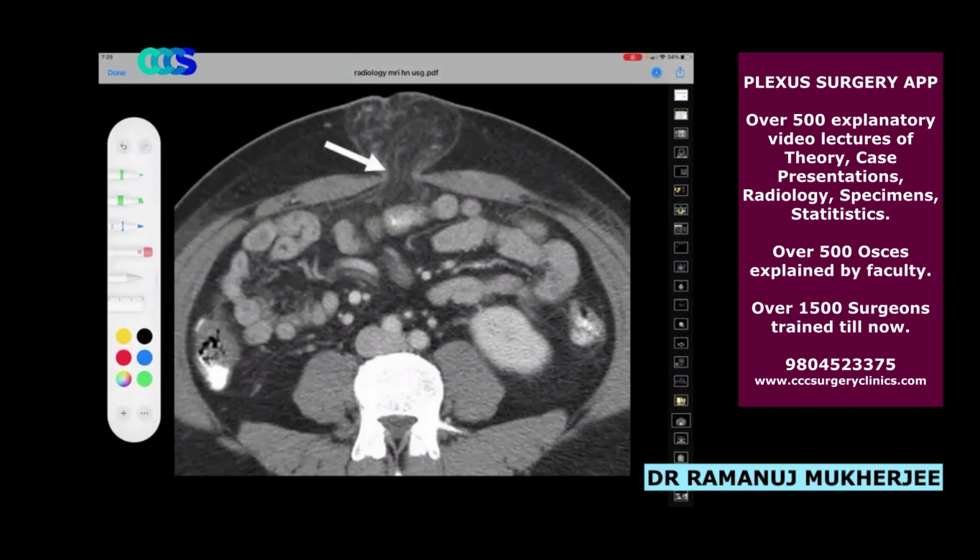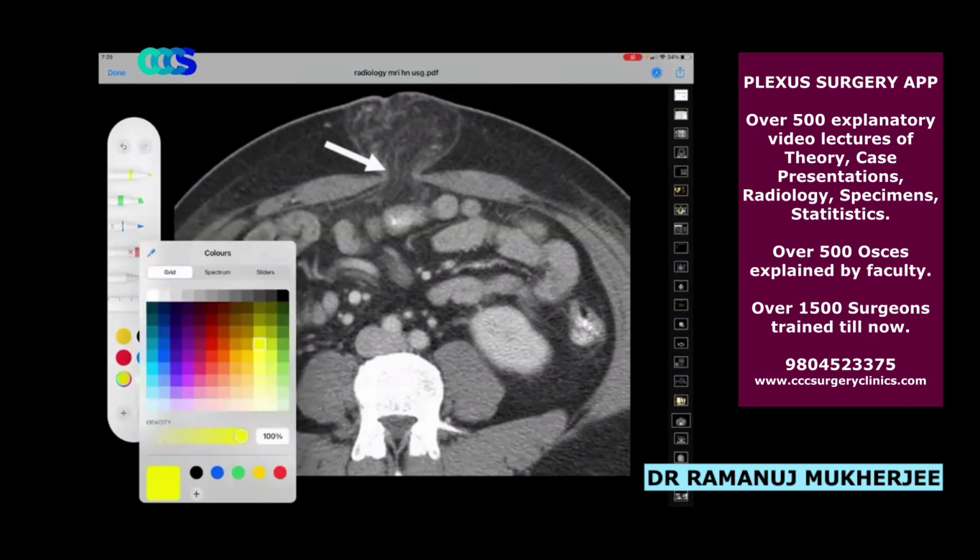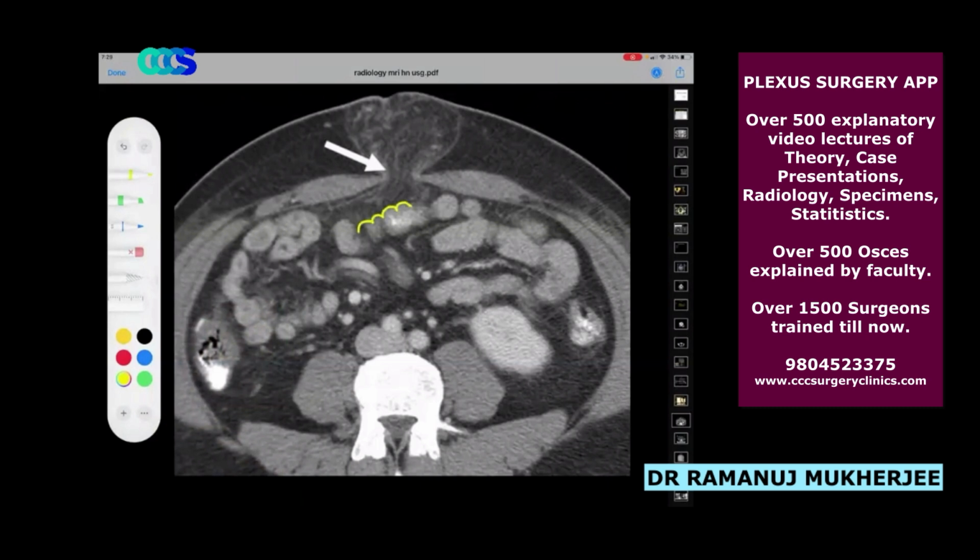The content is omentum. How could you say it is omentum, not a bowel wall? Contrast is not visible, number 1, sir. Very good point. If this was a loop of bowel, you would not expect to see it outside. When we talk about ventral hernias, we will look into that. What is important is that I can see something which is darker in color. If this is the mesentery M, this is darker than the mesentery.